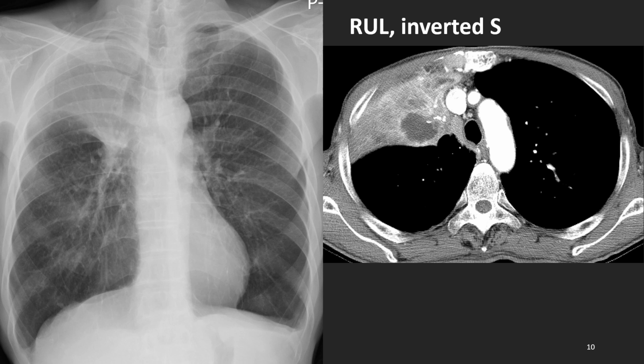This is contrast-enhanced axial CT. Proximal bulging, convex contour of mass, necrotic mass. Distal concave collapse of the right upper lobe, probably squamous cell carcinoma of the right upper lobe. Dr. Golden named this sign Golden's S sign, or inverted S sign.